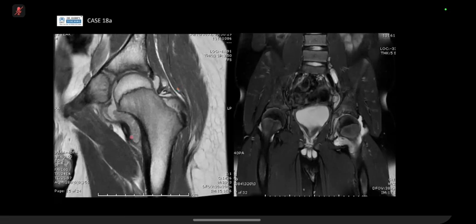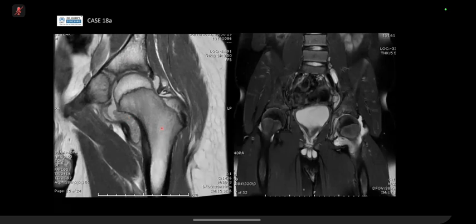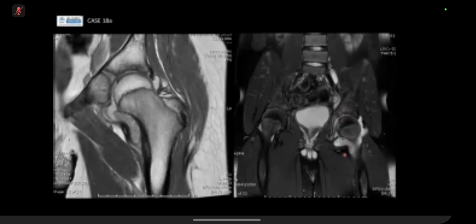So it's this synovial proliferation that's quite marked, and the absence of marrow edema. Often in septic arthritis, there will be some extent of marrow edema, and of course, prolonging it without treatment, you start to get more in the way of bony destruction, because of the inflammatory process. Now, on the MRI of the hip, we also look for other features. In this T2, there's probably irregularity of the chondral surface. It's probably just an incidental osteochondral lesion that's not associated with the underlying process.